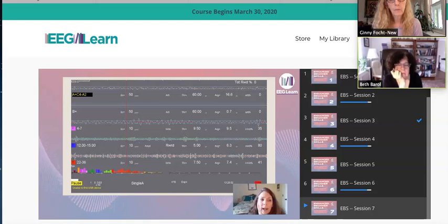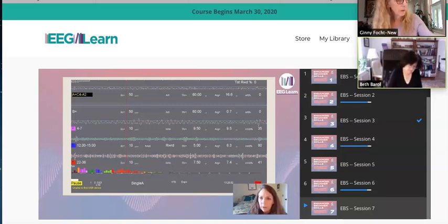You know, if you can have 10 microvolts of the 4 to 7 hertz activity on the map when somebody's not doing anything, and then when they're doing neurofeedback training, that's actually a task. So we would like their slow wave activity to be below 10 if they're an adult, and maybe below the mid-teens if they're a child, right? We want it to be a little bit lower. Well, we're good there because this person's 4 to 7 hertz activity is coming in at 9.5 microvolts.